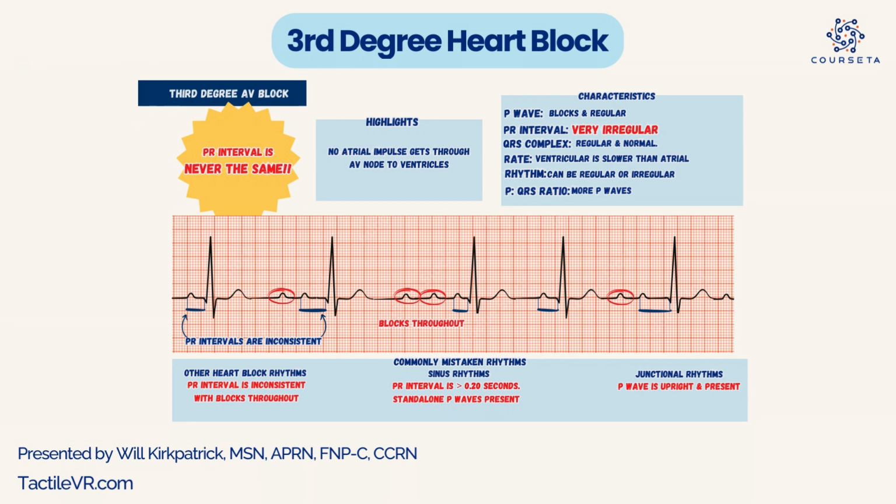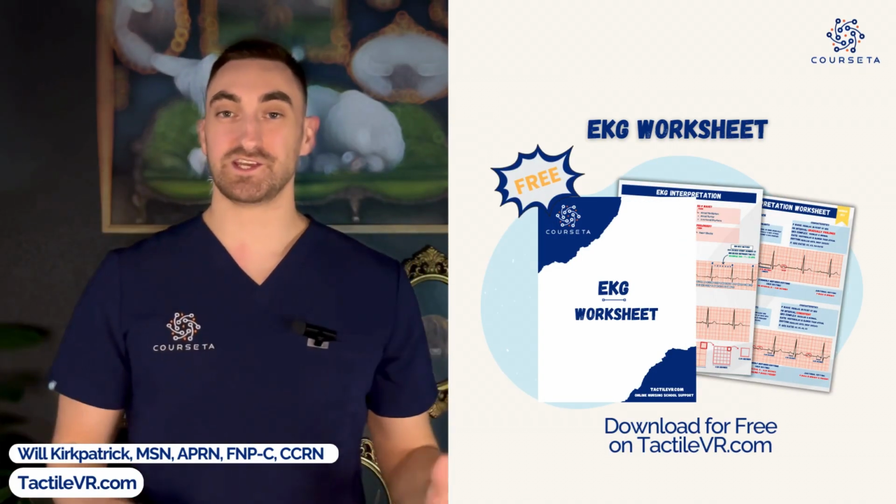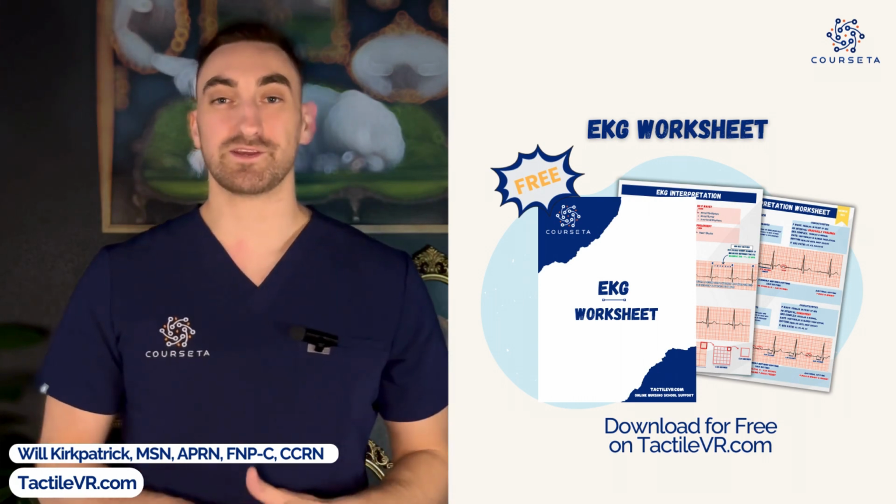As you guys can see here, there are blocks throughout the entire rhythm, right? But look at the PR intervals. If the PR intervals are not consistent throughout the entire rhythm, then you know that this is a third degree heart block. All right, guys, that is how you easily interpret heart blocks on your EKG interpretation exam. I hope we made it very simple for you guys.